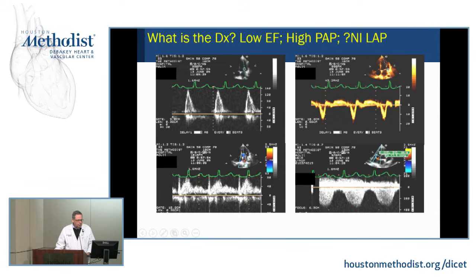And importantly, if you look at this, is this an E wave? Well, look at this. It's a P. So we have a prolonged PR interval with a P wave, and this is truly a summation EA. That throws diastology out. We cannot do any diastology assessment. However, the PA pressures are high. So, slight reduction in EF, high PA pressures, long PR interval.